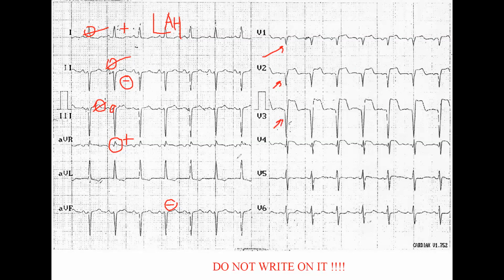So the chest leads. I think there are pathological Q waves in V1 to V3.